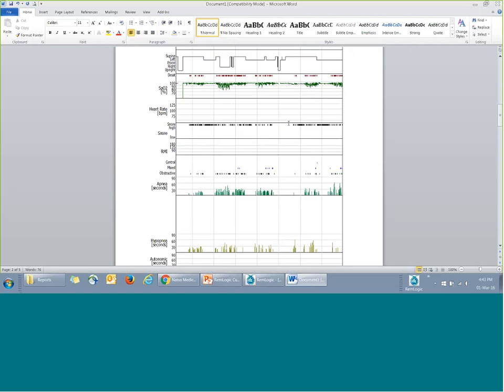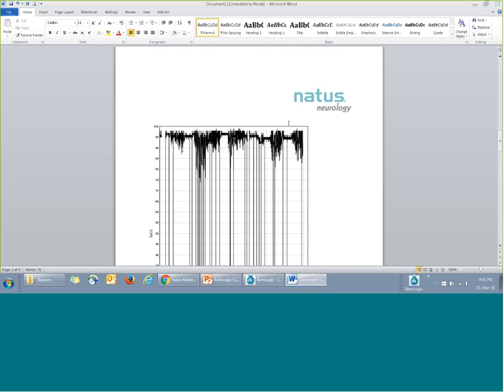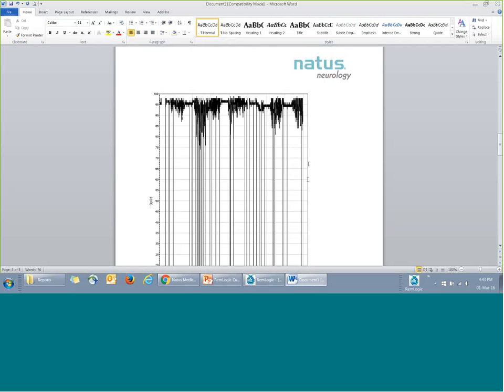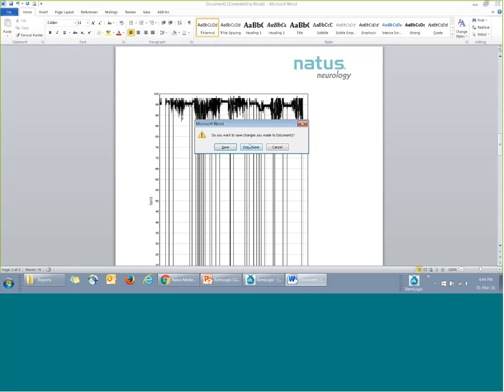Okay, so this is the one-page summary graph. So this is what I meant when you want to adjust the graph. We can actually adjust this to another way that you wanted, so we can adjust it accordingly. But you have to do a few rounds of testing for the trace overview. Okay, so let's try not to change its size.